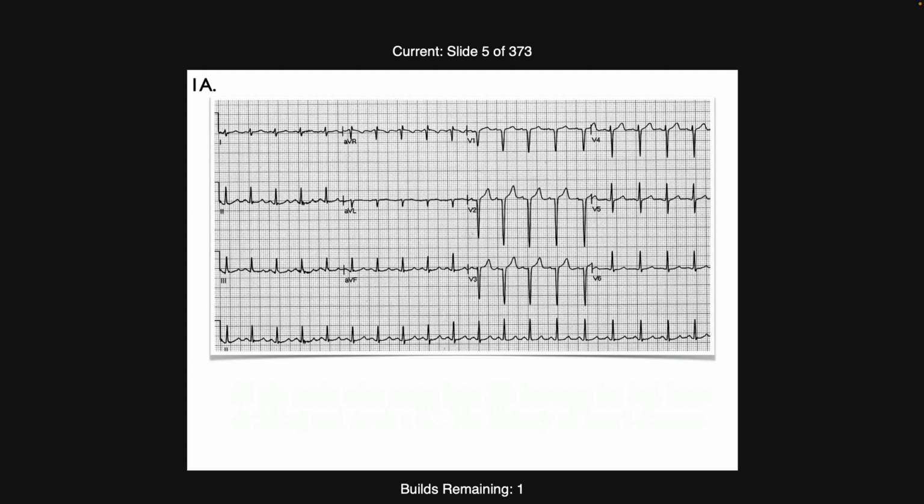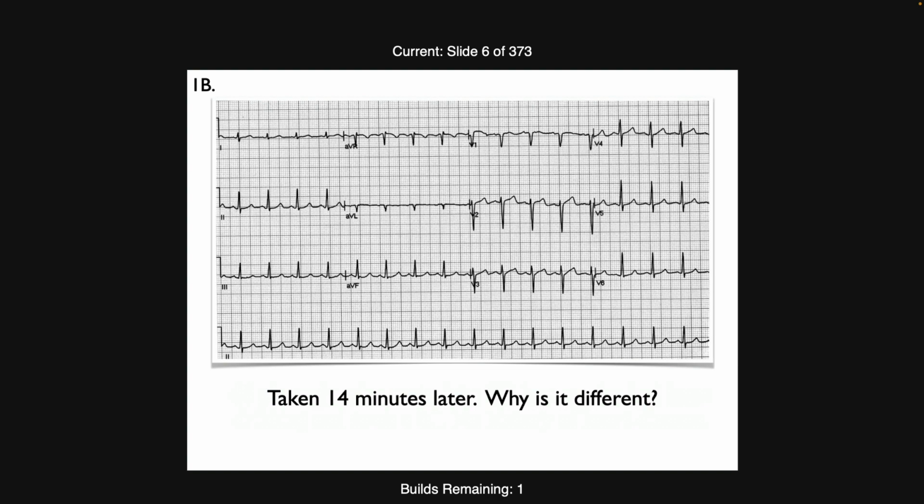And then I went looking, because I'd never heard of that, to see if there was an alternate placement, and bumped into this case. So no, there's not an alternate correct placement, but I thought this was kind of interesting. Okay, let's look at the next one.